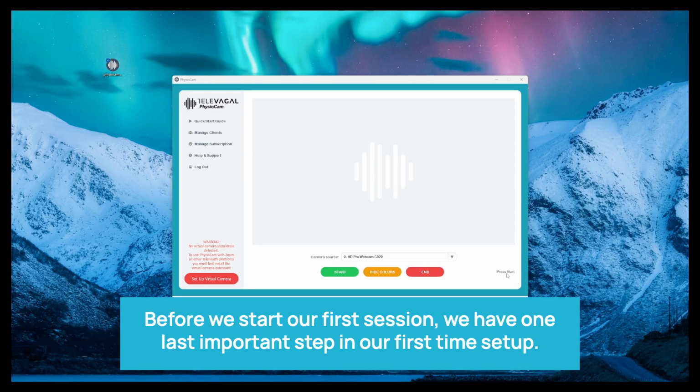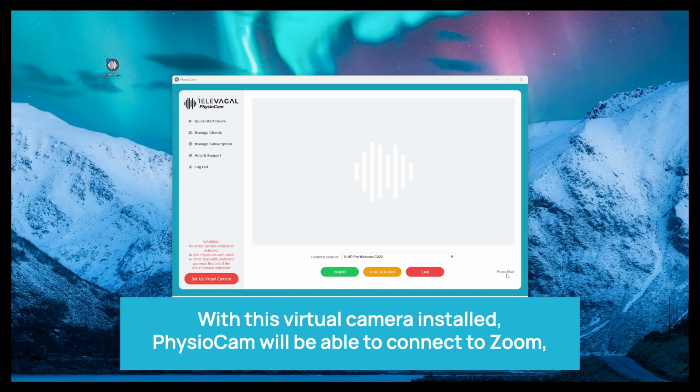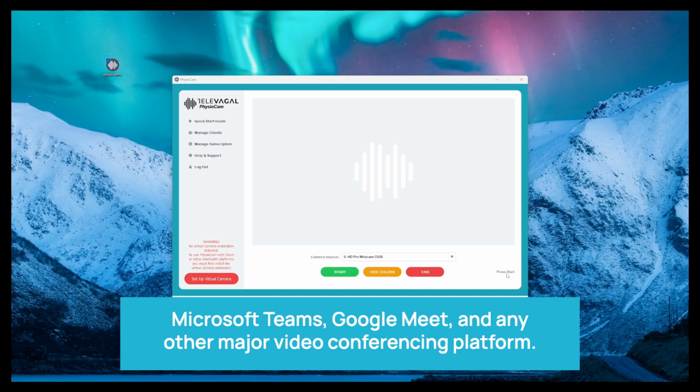Before we start our first session, we have one last important step in our first time setup. In order to use the PhysioCam in telehealth calls, we also need to install a PhysioCam virtual camera. With this virtual camera installed, PhysioCam will be able to connect to Zoom, Microsoft Teams, Google Meet, and any other major video conferencing platform.